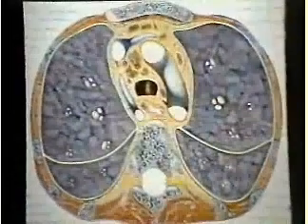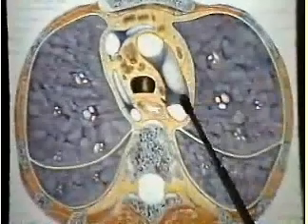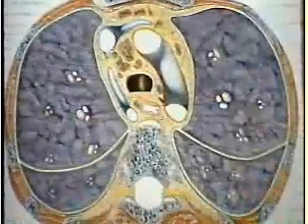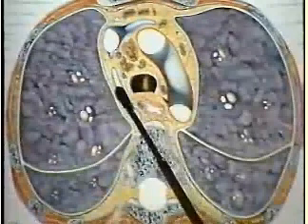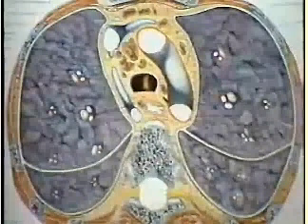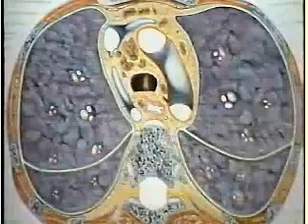If we take the anatomist's version of what we're looking at, here the aortic arch, here's this cluster of lymph nodes, which the anatomist has drawn of a pathologic size. They may be either above or below, or in this case, adjacent to the arch of the azygos vein. That's the region that we're looking at. Those are called the paratracheal nodes, even though you can see that they're really anterolateral to the trachea.